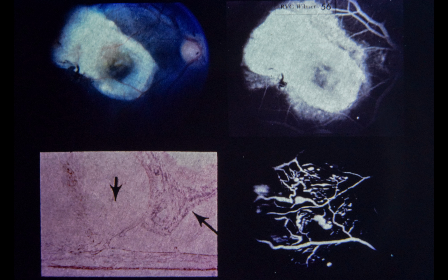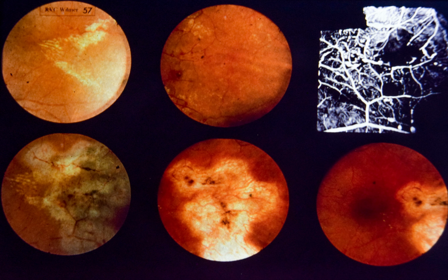Slide 57. Xenon arc photocoagulation for retinal telangiectasis. This 47-year-old white male complained of reduced vision left eye for 3 months. Right eye vision was 20/20 and the fundus was normal. Left eye vision was 20/40 because of macular edema. Upper left, note lipid deposition temporal to the fovea. Upper center, note telangiectatic vessels just temporal to the lipid.